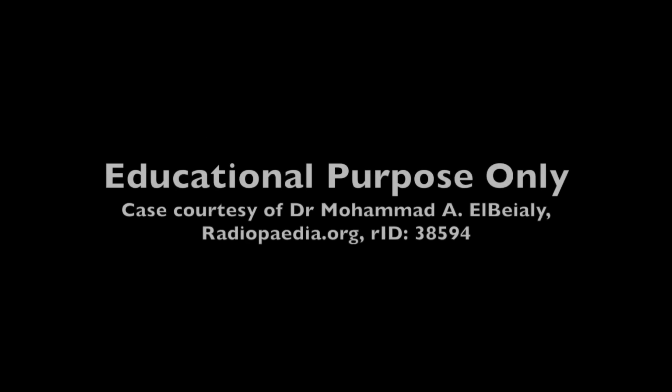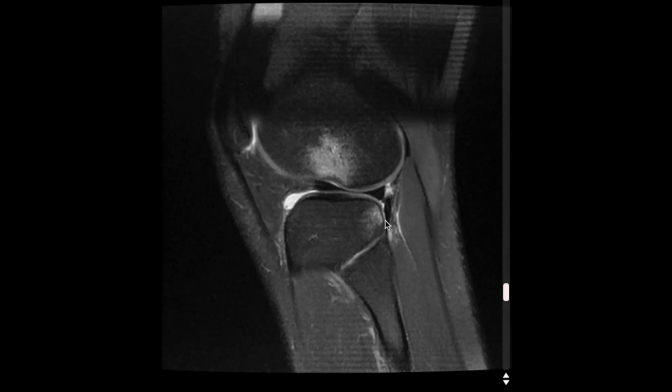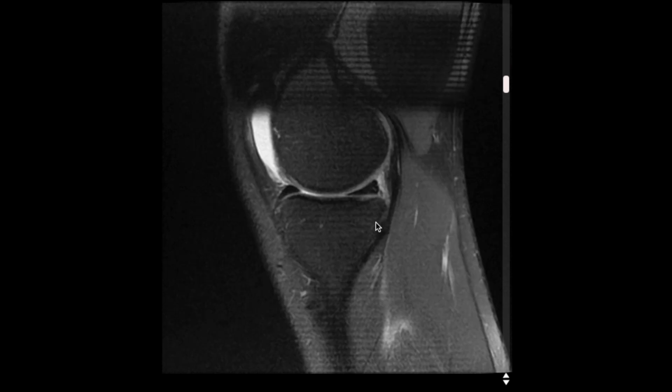Today we're going to talk about a simple, straightforward look at reading an MRI that potentially has an ACL tear. Typically what I'm going to do is start with scrolling through the screen looking for the most medial aspect or inner aspect of the knee. I typically like to start with what's called the sagittal view and a fat-sat sequence, basically a sequence where white, which you can see here, is highlighted as fluid.